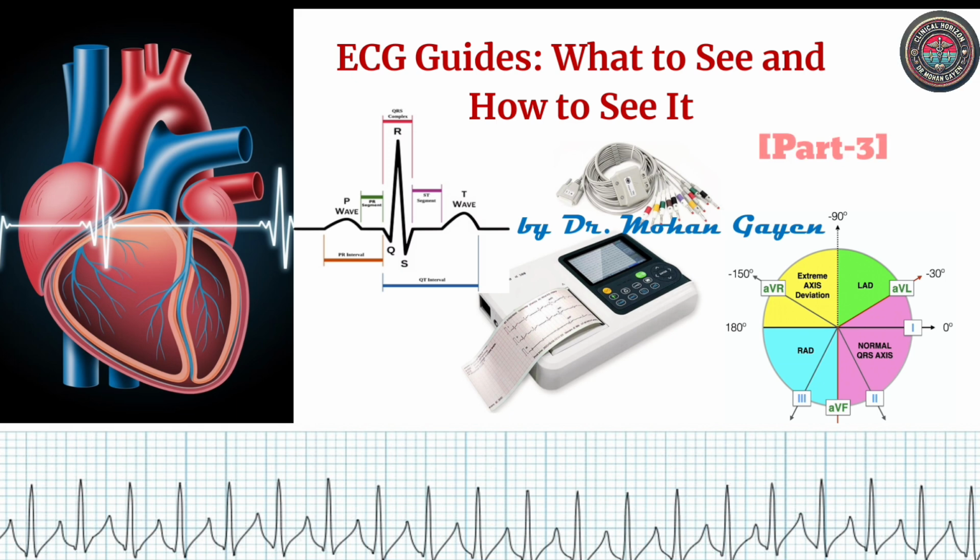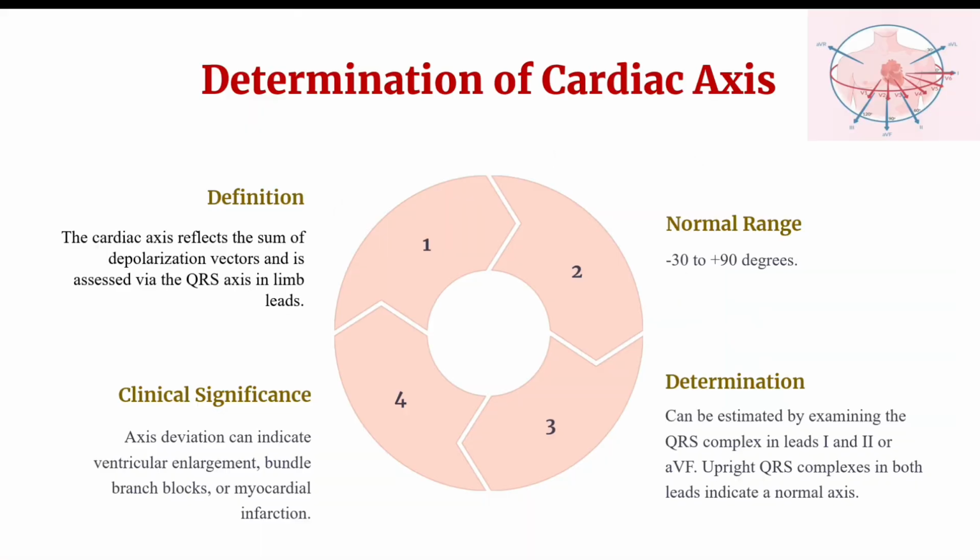down step by step. In this lesson, we will discuss what the cardiac axis is, why it matters clinically, and how to determine it using different methods. We will explore quadrant analysis, 3 lead methods, isoelectric lead analysis, and graphical method, along with their practical applications. By the end, we will apply these concepts to real ECG cases and important multiple-choice questions, ensuring you can confidently determine the axis in any ECG you encounter.